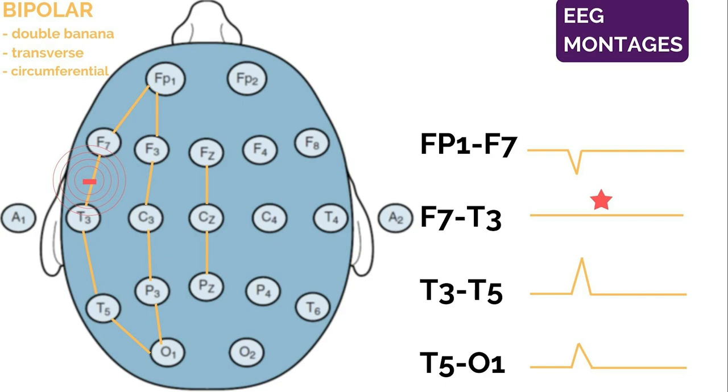Now, we can't really tell by looking at phase reversal where the point of maximal negativity is at. So this is a tricky scenario that we should know about. If we have an isoelectric, so in this scenario, the point of maximal negativity will be where there's isoelectric activity.